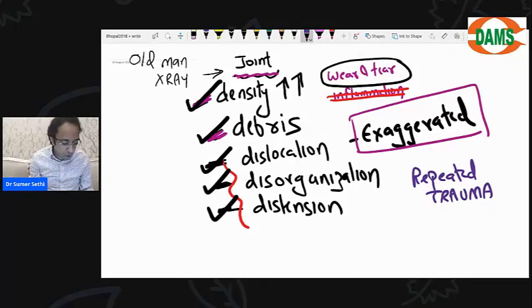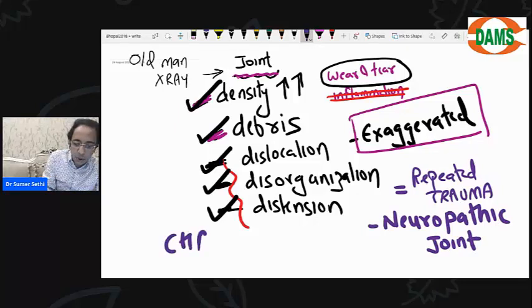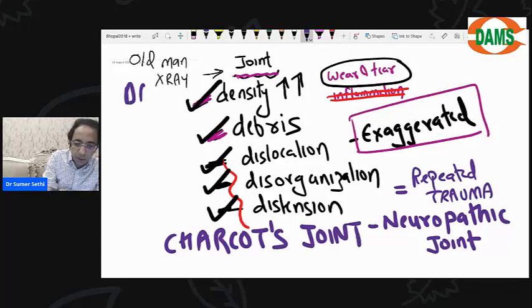Okay, उसको बार बार चोट लग रही है. Okay, but my question is, let's see if you can answer. उसको बार बार चोट लग रही है तो अपने आप को बचा क्यों नहीं रहा? If he is having repeated trauma, then why is he not saving himself? Because he has no sensation. उसको sensation ही नहीं, वो diabetic है. This is what is called as neuropathic joint, described by Charcot. So we give him respect by calling them Charcot's joints, typically seen in people with diabetes.